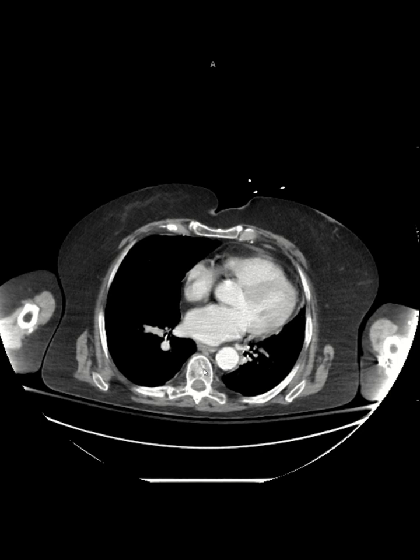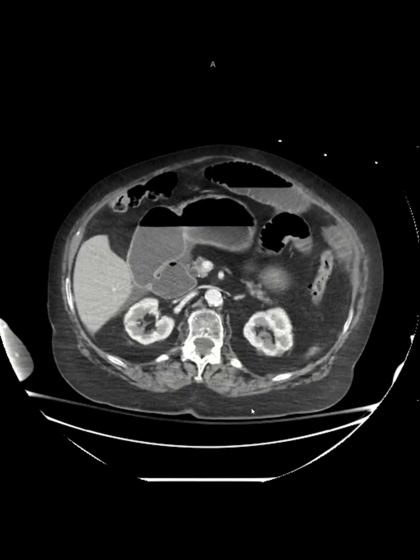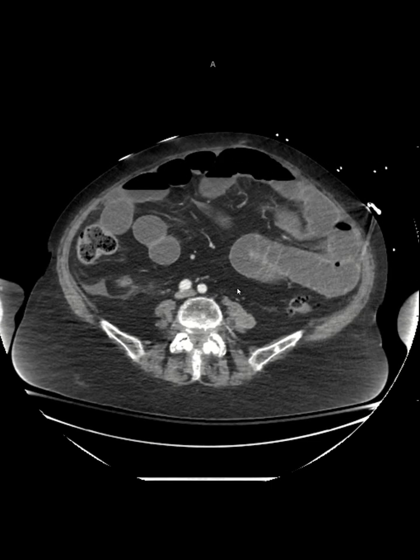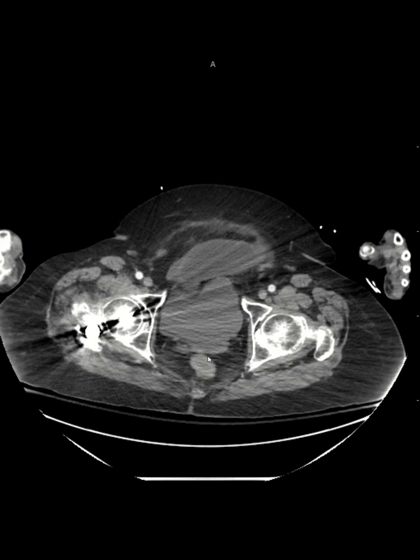This is an 89-year-old woman who presented with abdominal pain, nausea, and vomiting, and a CT scan was performed to evaluate for bowel obstruction. These axial images have been acquired in portal venous phase after injection of IV contrast, and as we scroll through these images, we find that the stomach is distended, and there are multiple distended small bowel loops throughout the abdomen and pelvis.